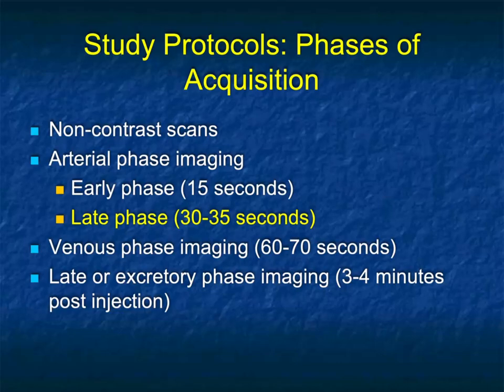Cholangios get brighter on later phase imaging, so that can be helpful. Also, not in the liver tumor category, but when you're doing a CT of the liver pre-transplant, you'll do arterial, venous, and delayed. So most of the time, it's 2-phase.